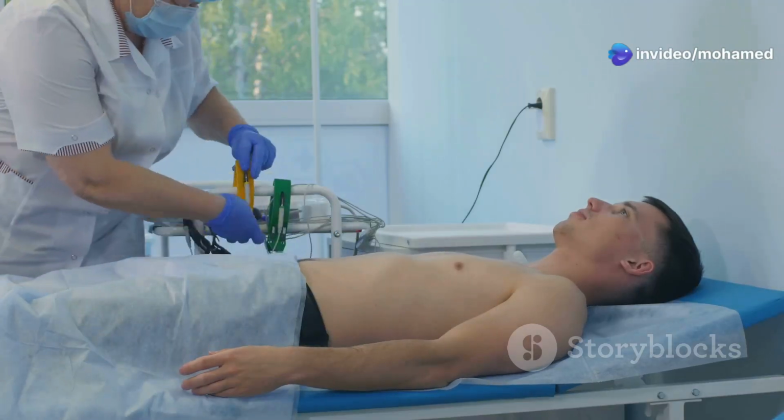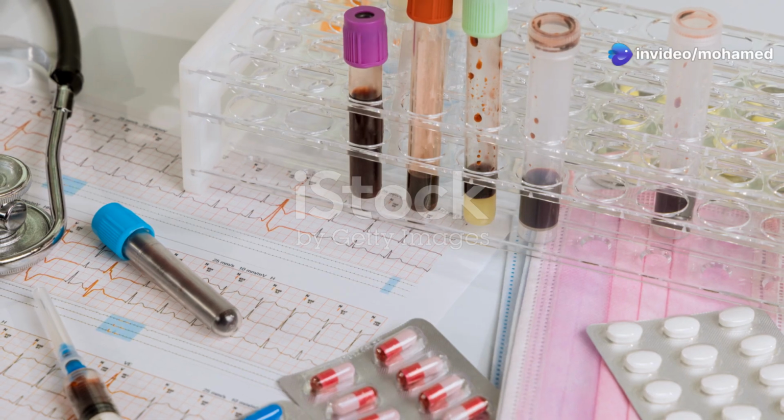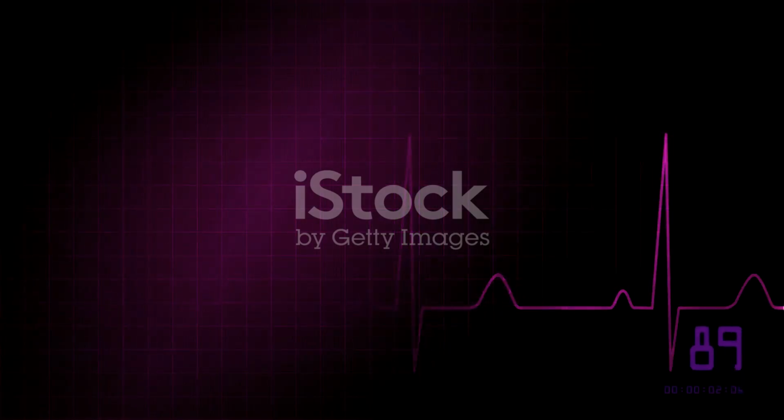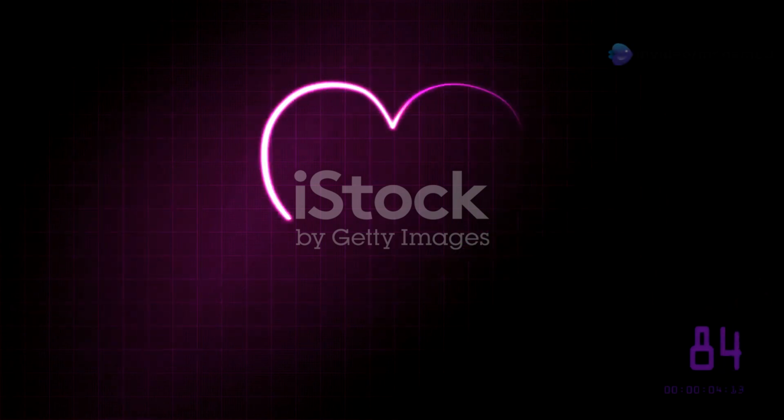ECGs are non-invasive and painless. They provide valuable information about the heart's function. This information helps us care for patients. In the following sections, we will break down the components of a normal ECG.